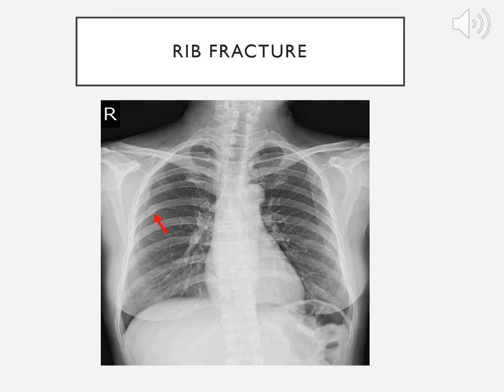And now that you are sort of being able to see what a posterior anterior view looks like, and you can look at these ribs, you can visualize that these posterior ribs are superimposed on the anterior ribs. So they look more apparent because they're closer to us than the anterior ribs. And so this is a posterior rib fracture. If you go up and count, 1, 2, 3, 4, 5, 6, 6th rib. A 6th rib fracture.